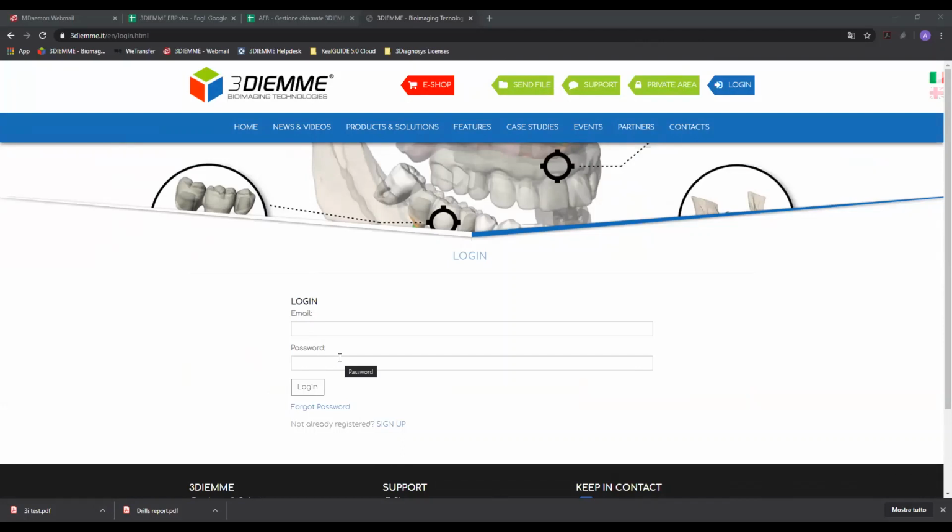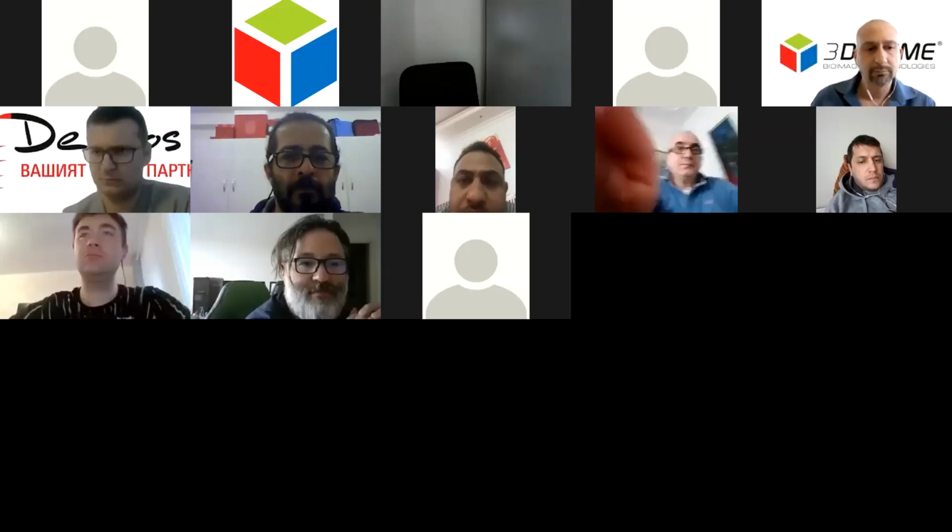After you have signed up, you can log in with your username, your email and password. Inside the private area, you will find the software downloads, information about the software, so hardware requirements, user manual, and so on, and also some video tutorials in English, if you want some more information. I can show them if you want, Alice, because I'm in. So I take the share screen.